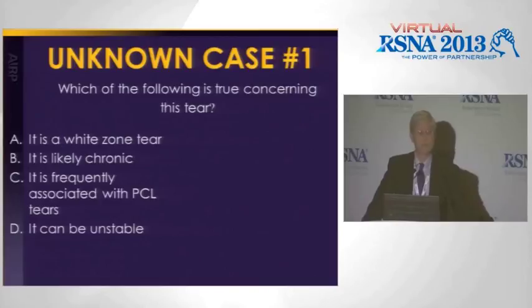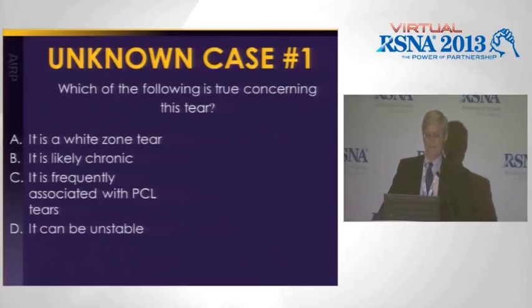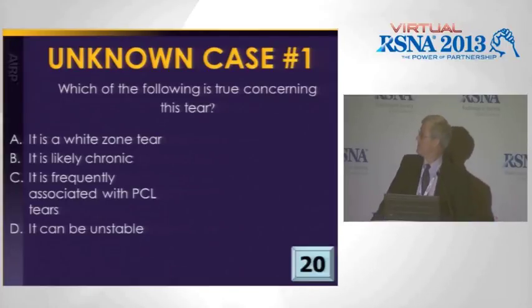So which of the following is true concerning this tear? Should be easy, right? Oops. Now it's really easy, right? You won't get this right only if you're asleep because I just flipped to the answer, right?